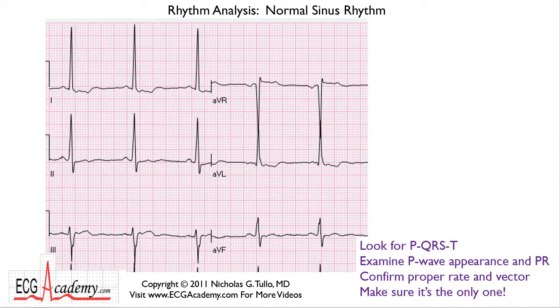Okay, one more time, we'll take a look at this. I'm only going to show you the limb leads because I want you to again recognize that if you're only looking at one lead like AVL, you might not actually notice much of a P wave. The QRSs are clearly very large, but the Ps are very small. And if you happen to be monitoring AVL, you may not even see the P waves, but clearly they're up right here in lead 2.